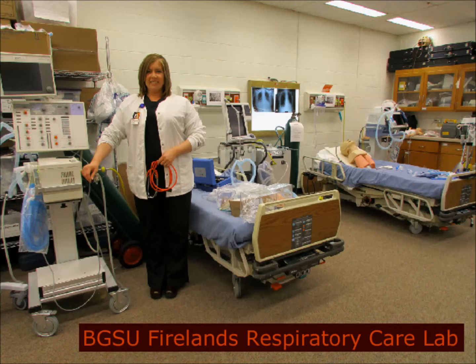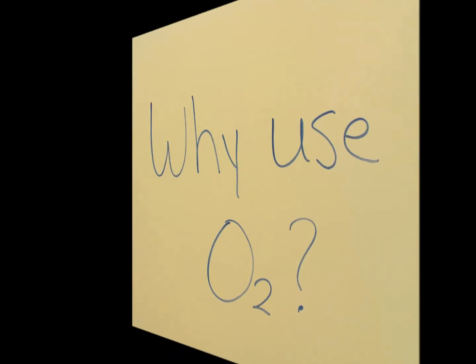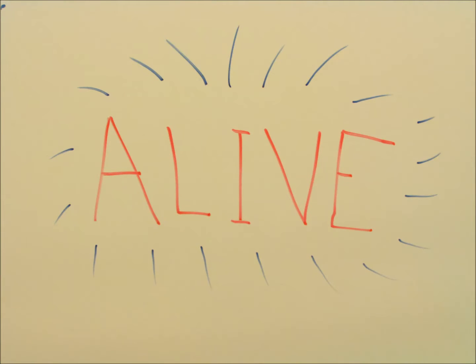In today's lesson, we will be looking at various oxygen devices. You will learn how to select the appropriate device and how to use the different devices available. We will start by answering the question, why do we use oxygen? Our body needs oxygen to stay alive, but how much oxygen do we need?